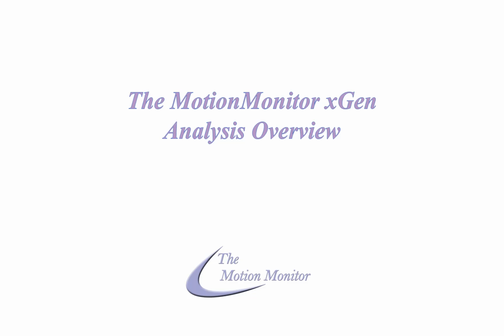In this training, we will provide an overview of the MotionMonitor xGen software with a focus on the analysis functionalities. You may follow along on your own device, just be aware that certain aspects of the software may look a little different on your computer. We ask that you make note of any questions that may arise and ask one of our client support engineers during your lab's personalized system training.